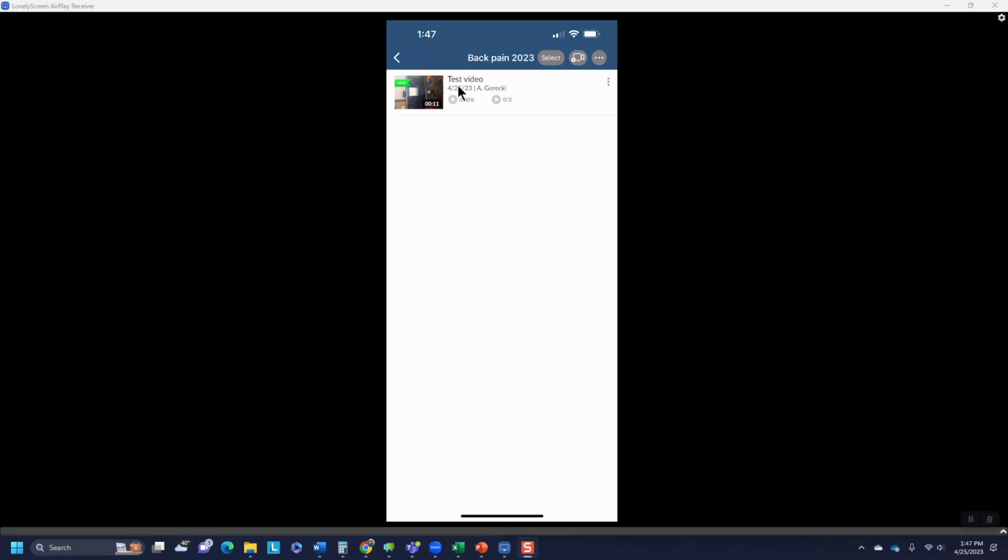And now from the patient's perspective, you can see they have a little green tag here that shows the video. You can see the name of the video, what the date was when it was made, what provider made the video, and then how many times a day you instructed them to do it. As they do, if they watch their 2 video views a day, it will close their rings. They get some confetti that goes off on their screen. And that's also part of our monitoring process. We're getting data when the patient is watching their videos.